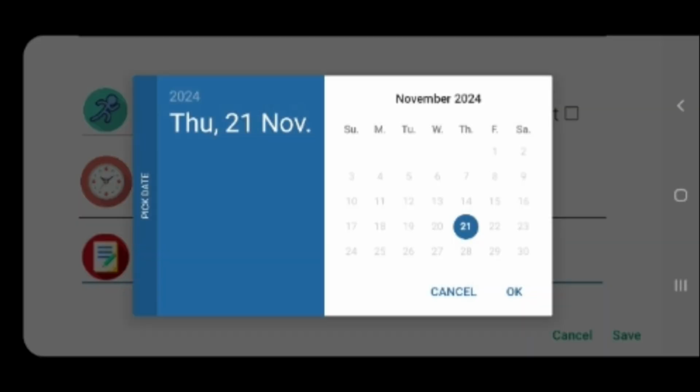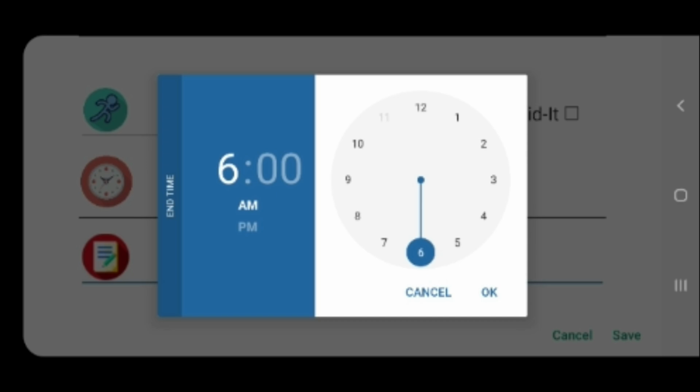And if I try to enter a future time, I can't actually, at the moment, enter past 10:16, because that's the time it is at the moment for me. So if you try and enter a time and you can't, it's likely to be because you have mixed up this AM and this PM, so just make sure you check the time.